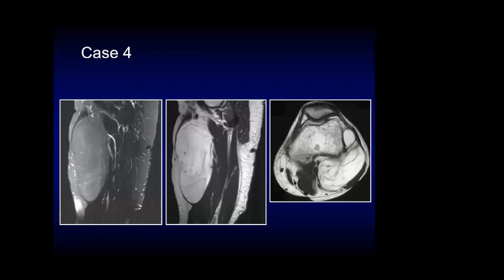Adjacent bone, cortical bone seems intact.